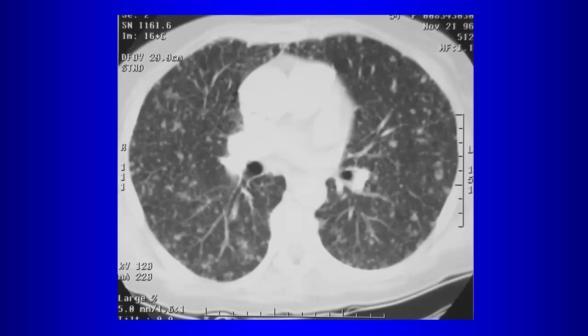Yes, you ask yourself, are the nodules touching the pleural surfaces? And the answer here is yes. If the nodules were not touching the pleural surfaces, then you would have centrilobular. The fact that the nodules are touching the pleural surfaces means you must decide between random and perilymphatic. So the next thing you do is what? So here, what do we think then?